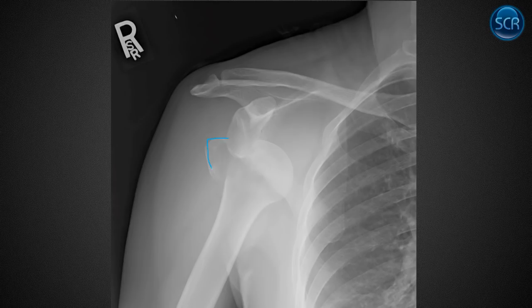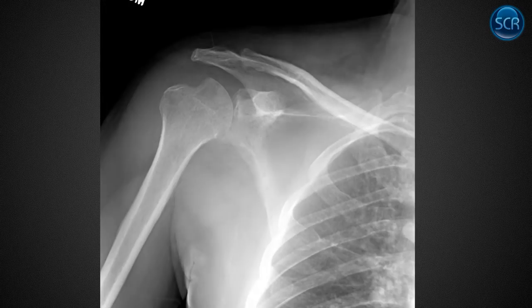In this case, they've managed to shear off the greater tuberosity. So this is a dislocation, and instead of getting a Hill-Sachs impaction fracture here, that fracture propagated through and actually just popped off their greater tuberosity. I don't see a Bankart lesion, which would be a fracture of the inferior glenoid rim. That's something else to look for.